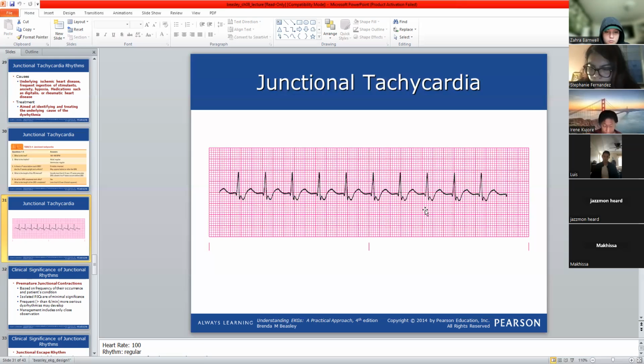You have to mention something which makes sense, which is the T wave. You say maybe here. No, it is actually here. But where is the P wave? We don't have any P wave. Do you see any P wave here? Do you see any character of a P wave, either positive, upright, or inverted? So we mentioned that in tachycardia, the P wave most of the time will be hidden under the QRS.